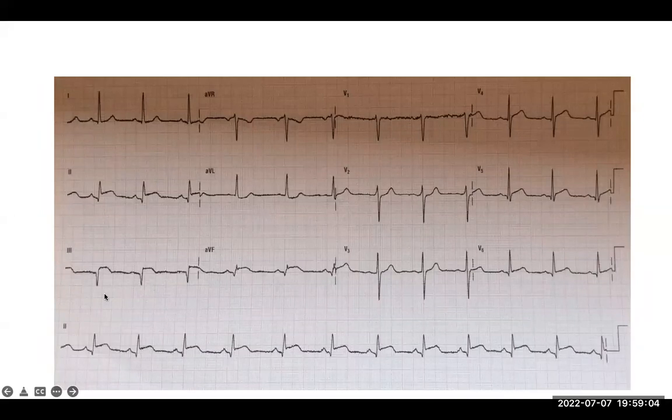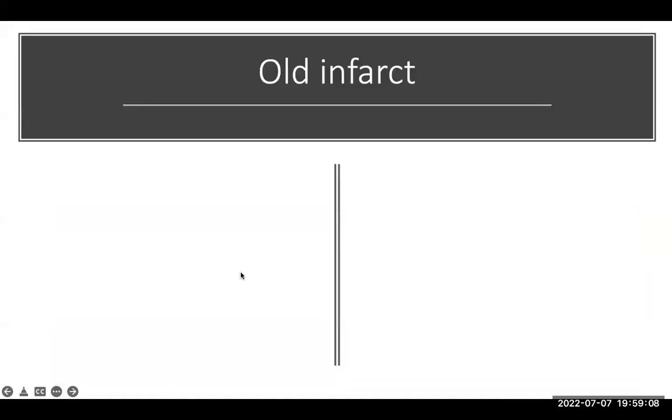Again, another picture of a patient who has got inferior ST segment elevation. These are the same examples. So in summary, acute coronary syndrome and ischemia, you concentrate at the ST segment. You look for elevation or depression. The most important thing is elevation because that's a patient whose vessel is completely blocked.